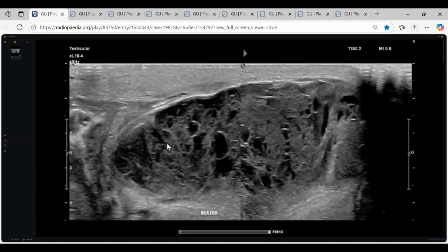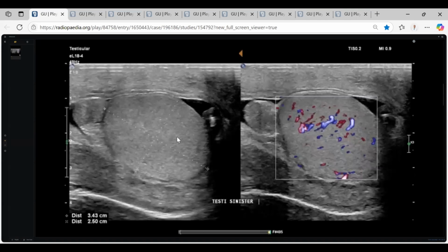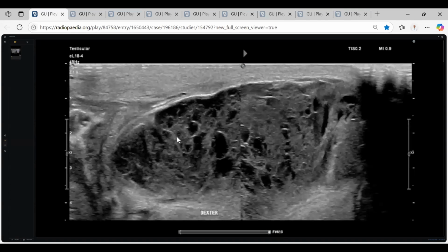After 2 weeks of trauma, this patient has cribriform septation. This patient neglected the ruptured testis for 2 weeks. What happened here? After the rupture, there may have been autodestruction of the testis itself with cystic change. If I told you the patient has a markedly swollen scrotum and fever with a neglected ruptured testis, what is this?